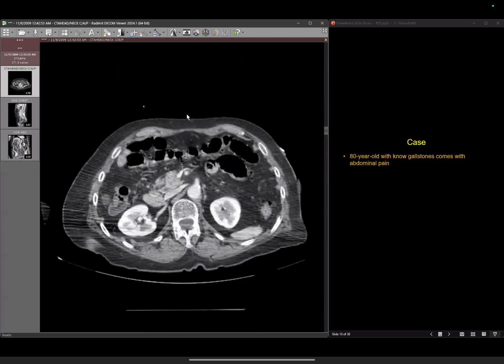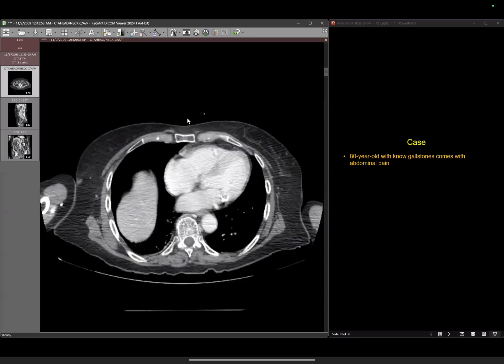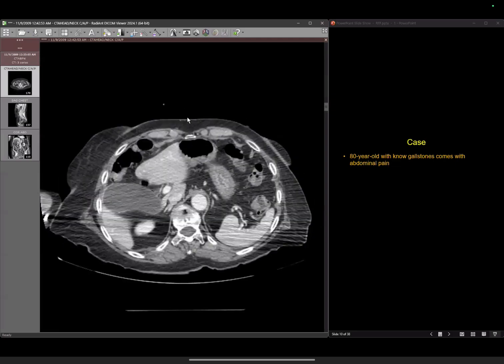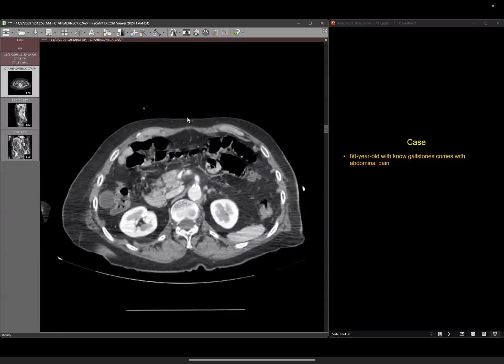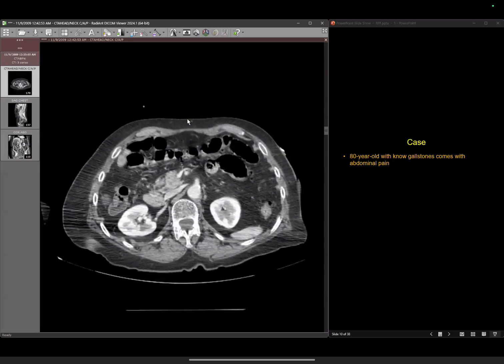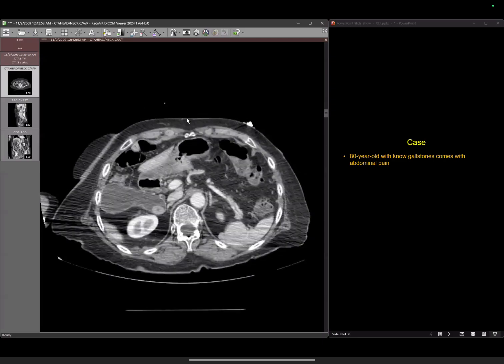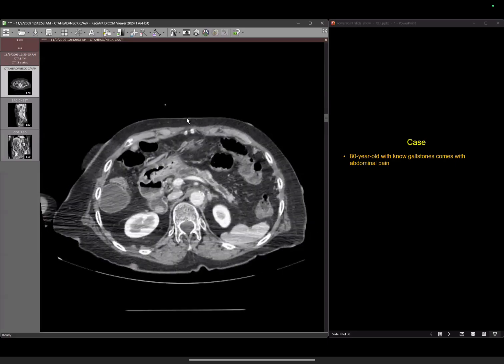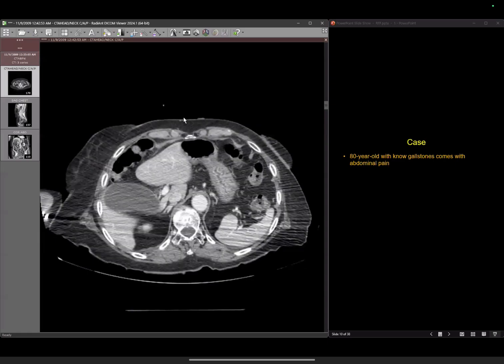So would you think about cholecystitis? Pancreas. Excellent. So what do you see? Yes, sir. The MPD is dilated, and there is significant atrophy of the pancreas, and there is an abrupt cutoff noted at the head of the pancreas, head and uncinate. Excellent. The pancreatic duct. So what will you tell them to do next?